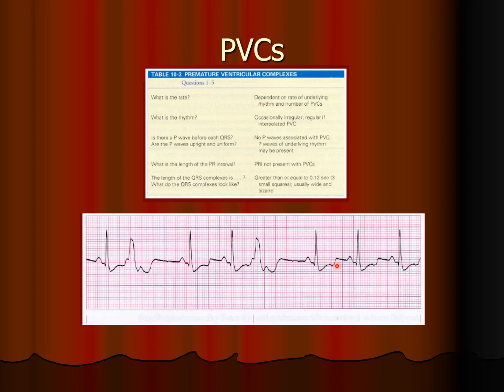And you astute students are wondering what's going on with the ST segment over here. That would require some follow-up. But we do have an upright T wave, or maybe it's flipped over. It's hard to tell on this strip. It could be an inverted T, which is a problem sign, or it could be ST depression, which is a problem sign. But that's not why we're here. We're identifying a rhythm. So we have most of the criteria. It's probably a sinus rhythm, but we got something going on.